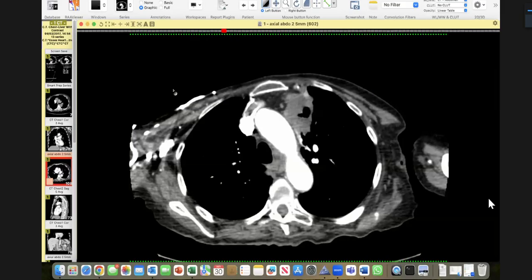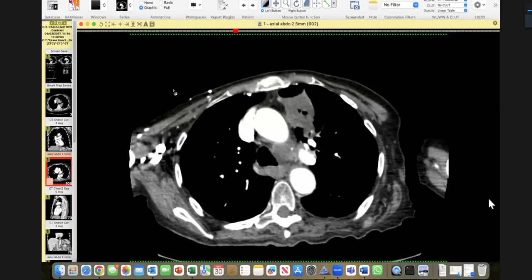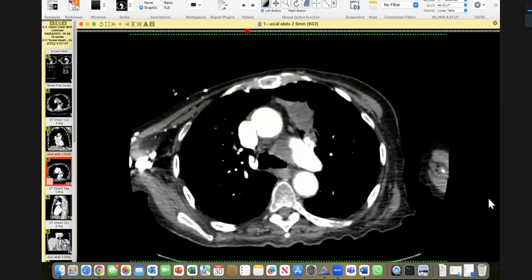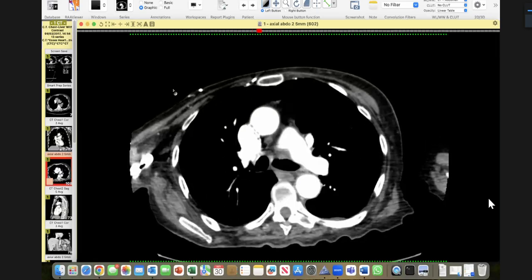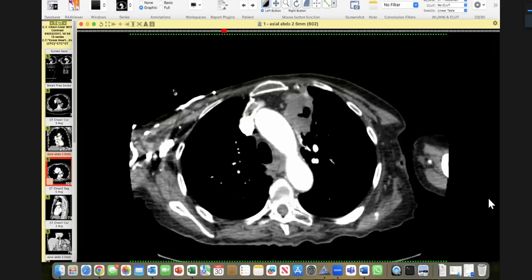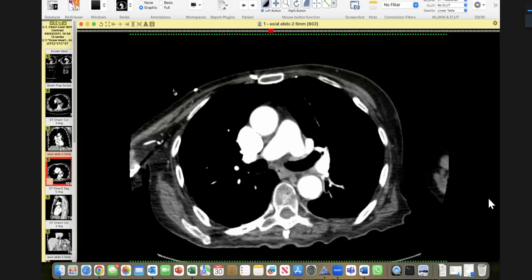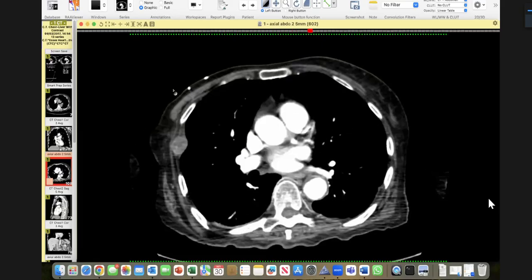I'm examining the pulmonary artery and the remaining vessels. There is some soft tissue here at the aortopulmonary window too. Okay, I'm scrolling down to see its extensions. I also want to examine the bronchi.